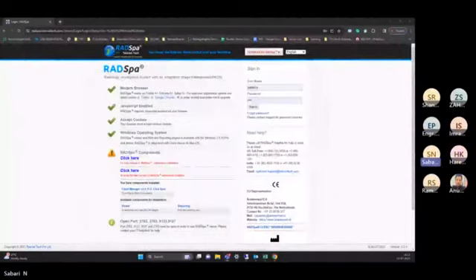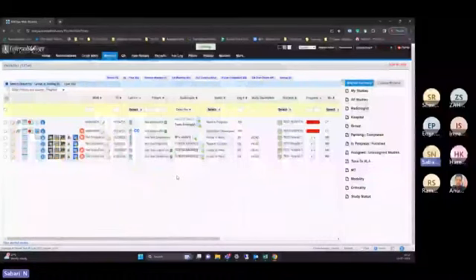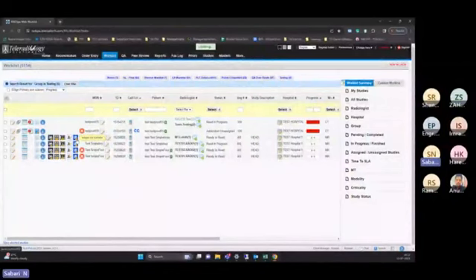Okay, so yesterday we saw the work list, what features and functions are available in it. So we'll continue from there. We have completed the select icon, settings, click to order, attachment, PDF icon, everything. Now we come to the image viewer part. I told you one day is not enough to complete all the features on the viewer, so we'll start from here.